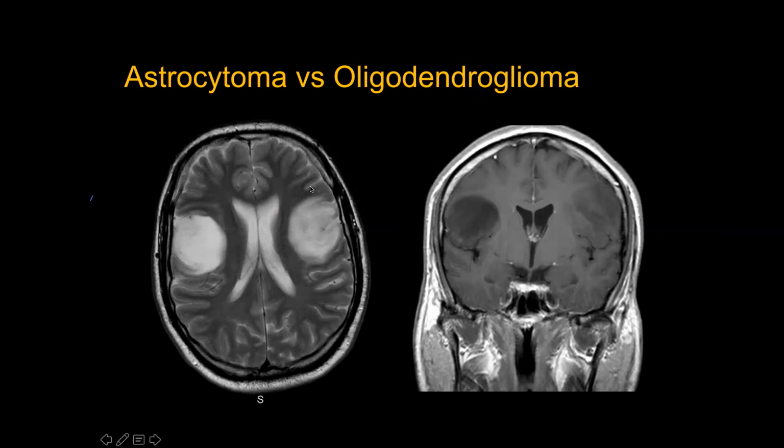This is an oligodendroglioma. Now, this case back in 2007, 2008 created a lot of problems because, firstly, no one believed that these are two tumors. And secondly, they said these two tumors must be exactly the same. But we said, based on the imaging characteristics, these two lesions are different. We suggested that they biopsy these lesions. Now, some surgeons agreed, some didn't agree about whether you should biopsy this.